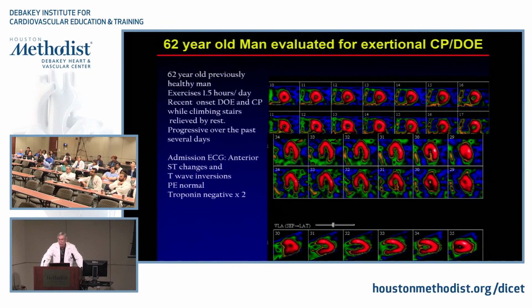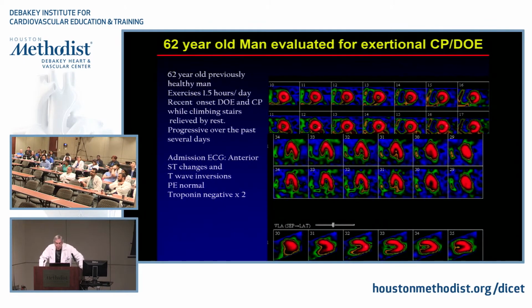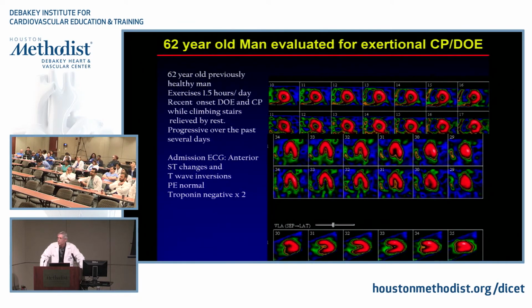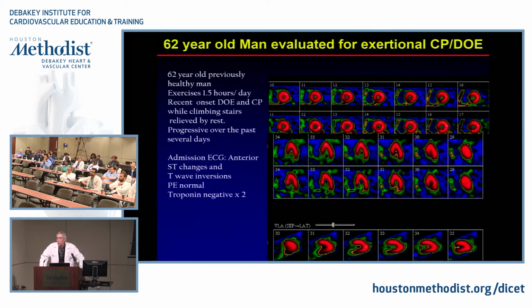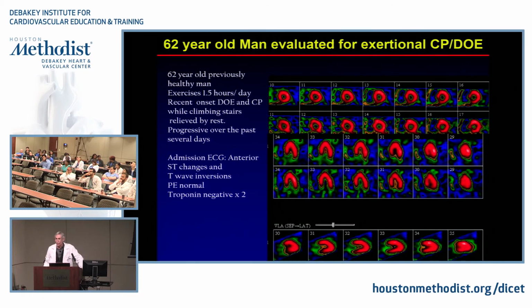Let me ask you this: what do you think about the right ventricle? Let's ask Mohammed, because he's seen a lot more of these than Omar has. What about the right ventricle? It appears dilated and hypokinetic. Yeah, it certainly looks dilated, and it's not particularly thick. It's just dilated and hypokinetic. Sometimes in people with severe right ventricular hypertrophy from long-standing idiopathic pulmonary hypertension, they get extremely thick and bright right ventricles, almost to the same degree as the left ventricle, okay?